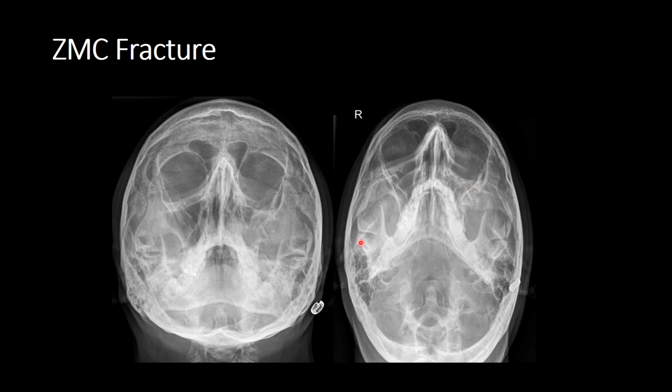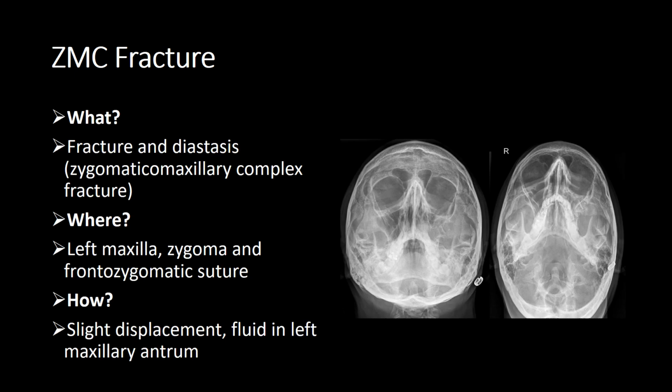Just quickly have a check of the maxilla. Oh, sorry, not the maxilla, the mandible. Okay, great. Let's carry on.